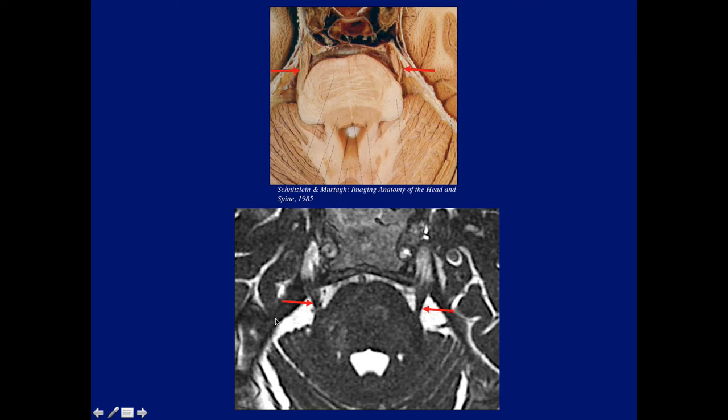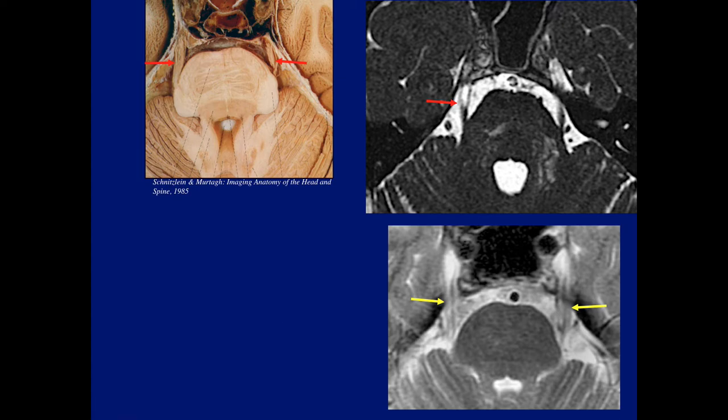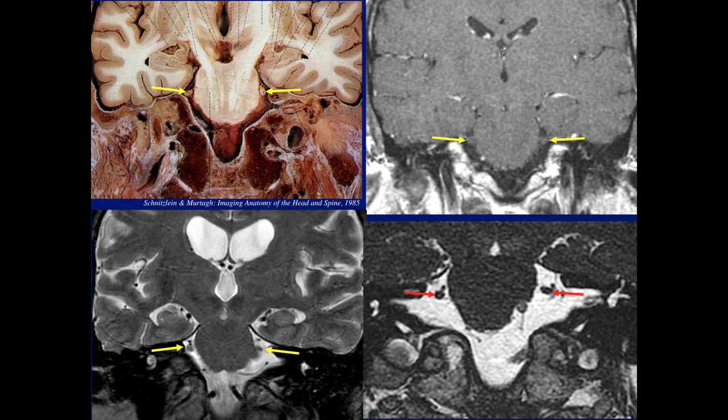Now, the reason for these problems relates to some obliquity, as you'll see later. Unless the patient is completely straight in the scanner, you will only sometimes catch partial imaging of the trigeminal nerve. Sometimes you will see early division of the trigeminal into the various fiber tracts going to V1, V2, and V3, as you can see in this image here, as well as in this image here, with separate fiber tracts instead of a single structure. So that was on the axial.